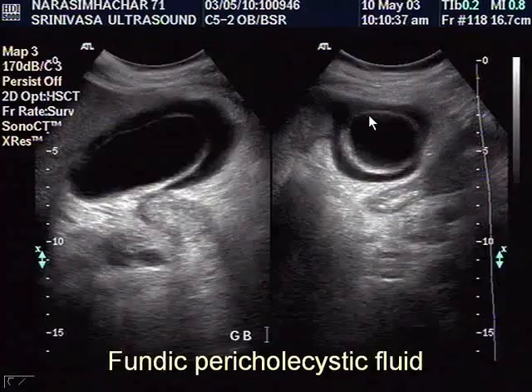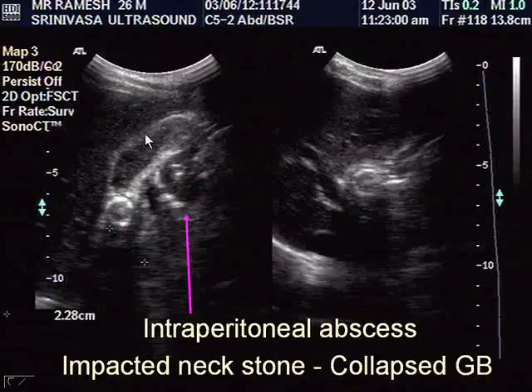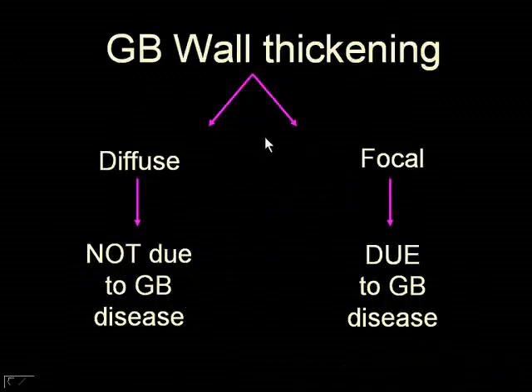That's perforation, again pericholecystic. When there is perforation, the gallbladder which was dilated collapses. That's a pericholecystic collection. The gas echoes over there in the collection. This gallbladder has collapsed in spite of an impacted stone. So with a gallbladder which is collapsed in spite of an impacted stone, one must be sensitized to perforation.